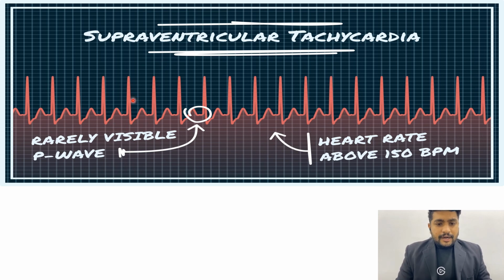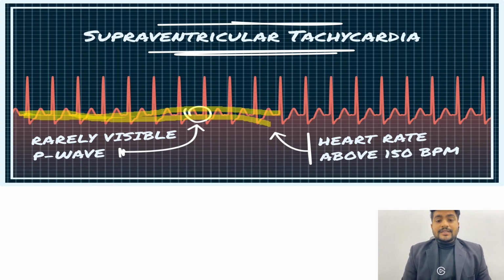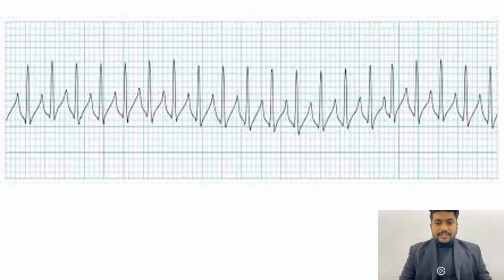You might also see that there is ST segment depression with the QRS complexes. Our ST segment is slightly depressed. So is this ischemic? Well, it can be ischemic or it cannot be ischemic. It is rate-dependent depression of the ST segment. Mostly it is not ischemic, but it can be accompanied by ischemia. This is our first example.